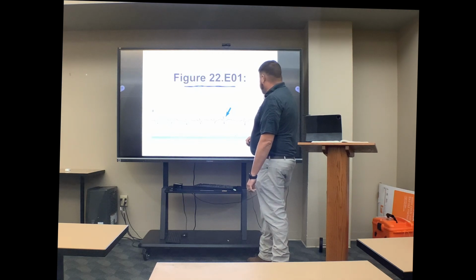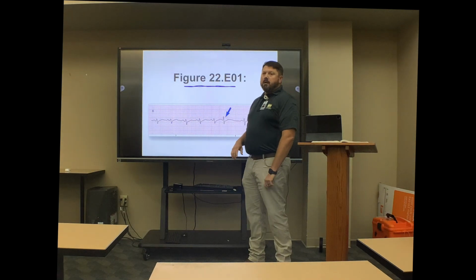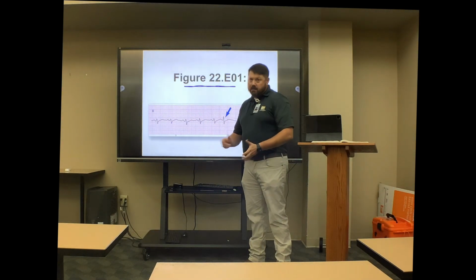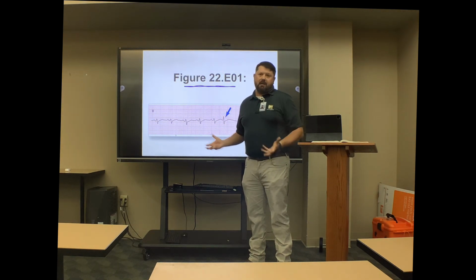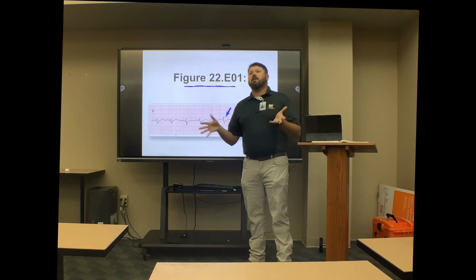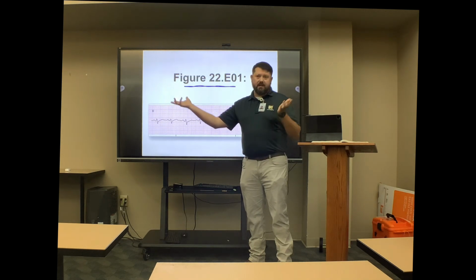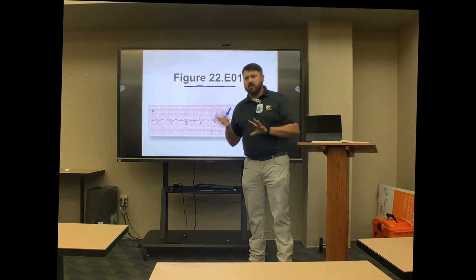Now, if I just see this, the patient is perfusing fine and I've got a rate of 80, there's no treatment that we're really concerned about here. The job of a paramedic student for a PJC is to identify it on your quiz, identify it in your test, and then identify it if you see it in clinicals, and watch to see if there are any changes.